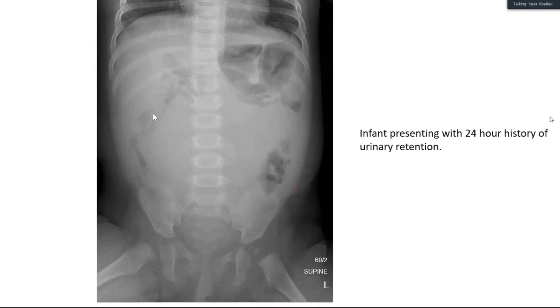All right, so you mentioned that because there's loss of this fat lucency, I suspect that this might be a retroperitoneal lesion. Now you see this, the air in the abdomen could be either pneumoperitoneum or within the bowel. If this is not abnormal air, that means it is in the bowel, but the bowel is pushed. So once you see that this is pushed, you mentioned the other reason I think this is a mass is because the bowel looks displaced from its normal position. It's peripherally placed rather than central. True? Okay. And you mentioned the bones adjacent to it. You mentioned there is no erosion, there is no destruction in the bones.